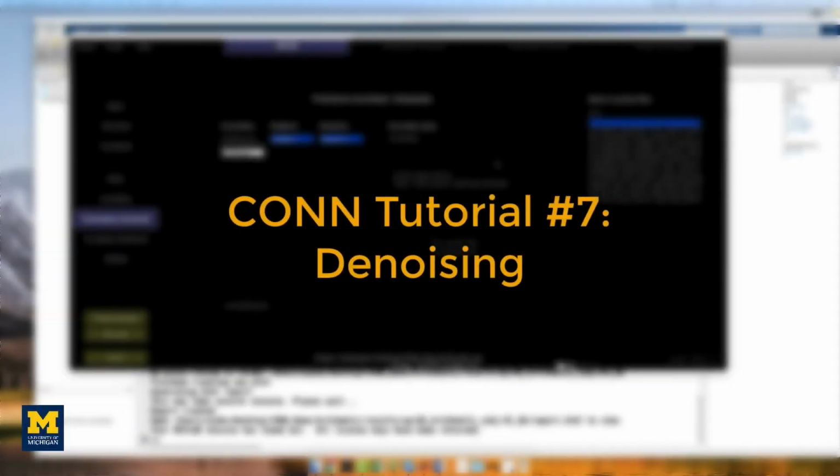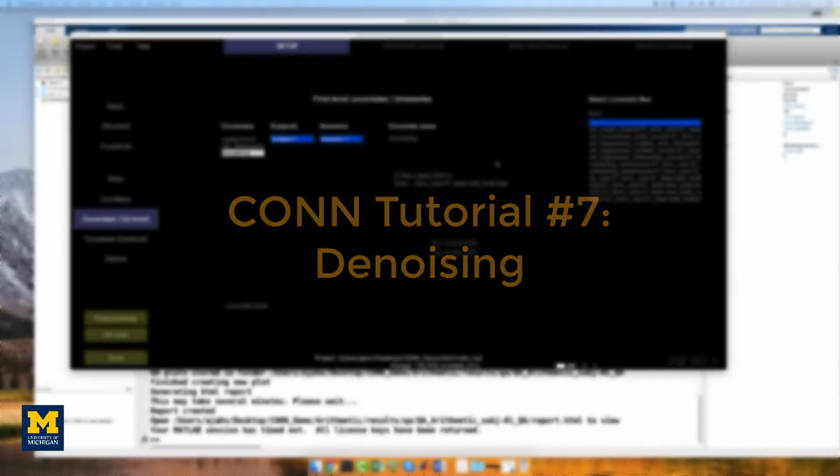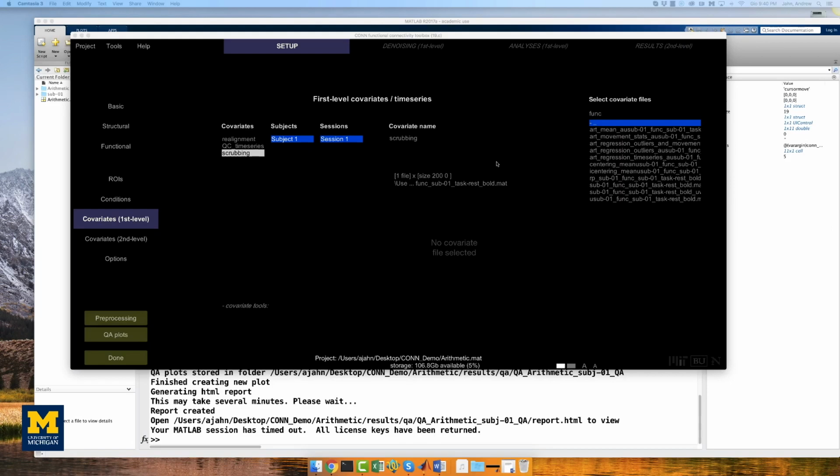One of the most important steps for cleaning up resting state data is denoising. Of course, removing noise is necessary for any imaging analysis, but resting state data, in particular, is very susceptible to artifacts such as linear drifts and motion effects. To begin denoising the data, click the Done button from the Setup tab.